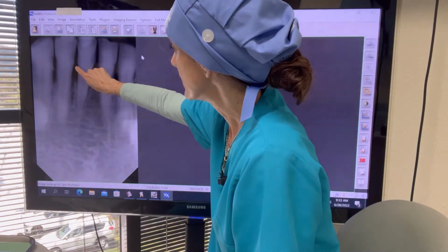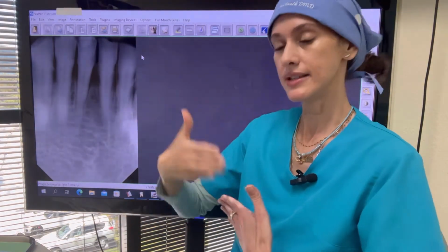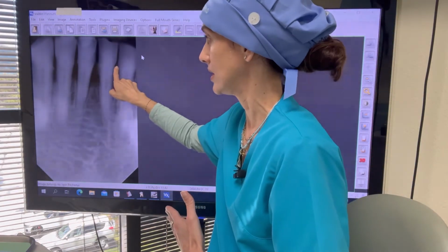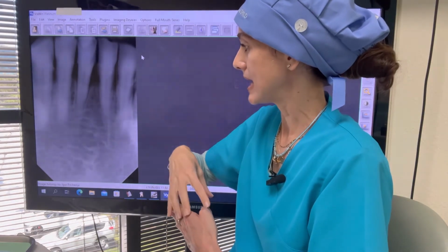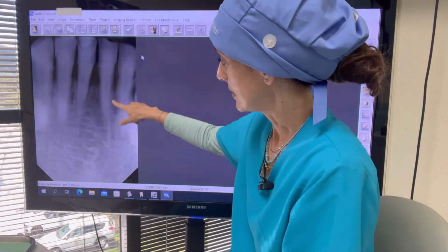You can see here, I don't know if it's clear on the video, some spiked areas. This is a two-dimensional picture, so we only see 2 dimensions. But that tartar that I can see radiographically, it goes all around. So that is making the patient lose the bone because there's more destruction, bleeding, inflammation. So you lose the bone. And this is what's happening, the result.